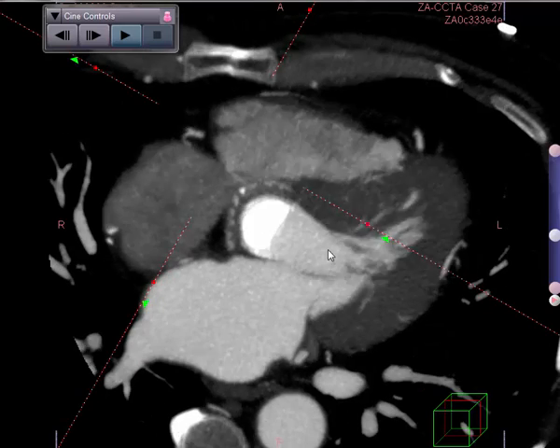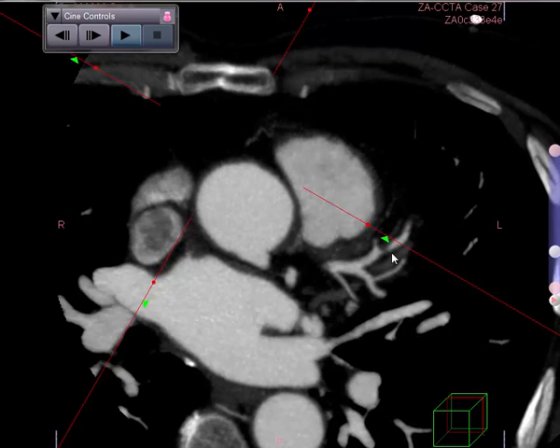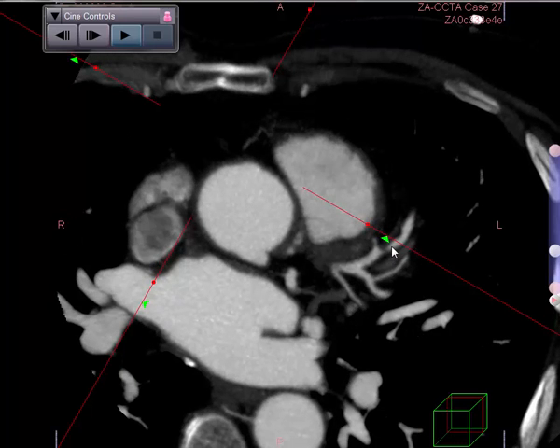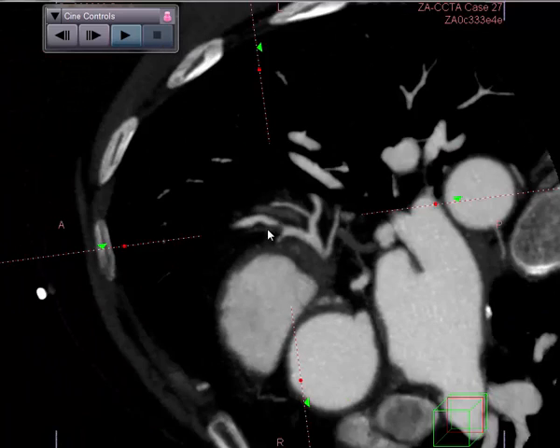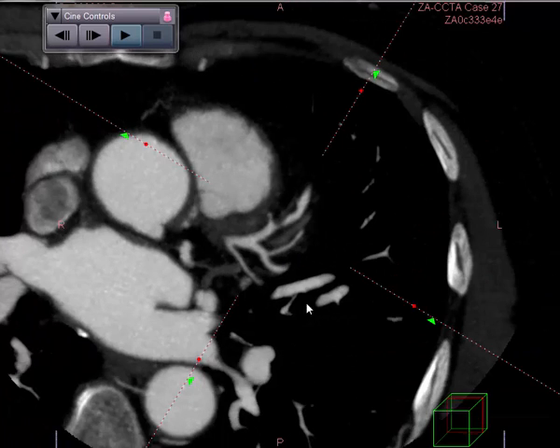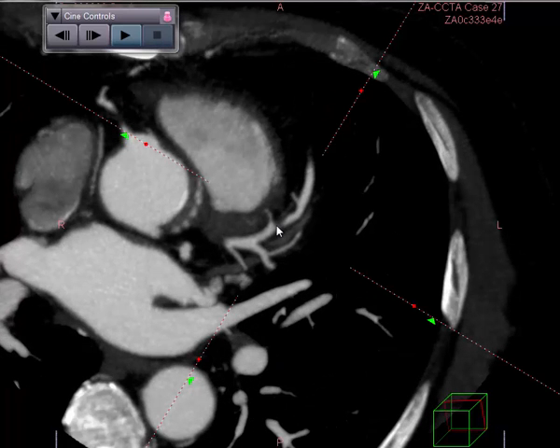So we have a patient who has clearly what appears to be evidence of focal obstructive disease. As to why this is the case, since he probably would have had a coronary arteriogram done 6 months previously prior to his aortic valve replacement, it's hard to say whether this is thrombus or non-calcified plaque, but just the same, he has obstructive disease.